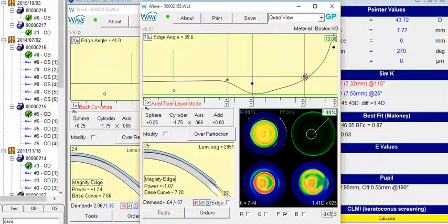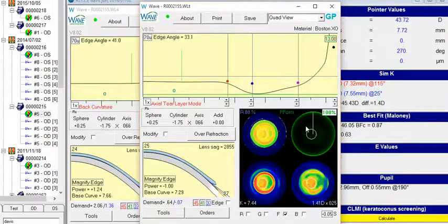And then we looked at bringing this pink in just a little bit smaller than the corneal diameter. And again, you can follow these steps more precisely on the Wave fitting design tutorial. And then we try to pin this pink dot here at the 20 micron line.